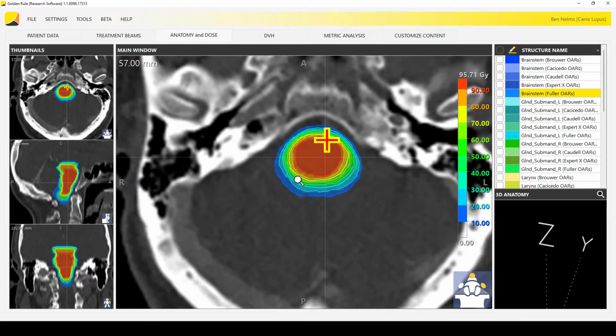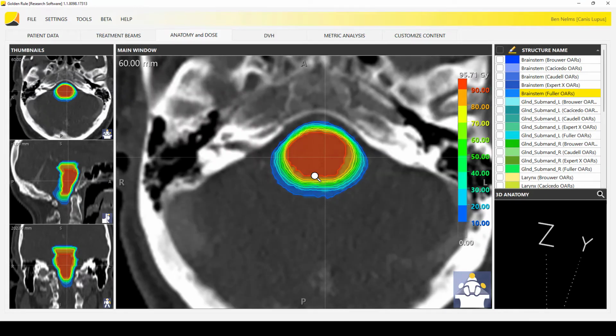So here are the consensus contours. In today's session, I'm setting up the model that I'm going to use for looking at AI generated contours, but we're going to use an expert today. Jimmy Caudell from Moffitt was one of the experts on the panel. I've known him for a good time and totally respect him. When it comes to head and neck contouring, he is intense and a very good teacher. Since I know Jimmy, I'm going to pick on him, because he probably wouldn't mind.